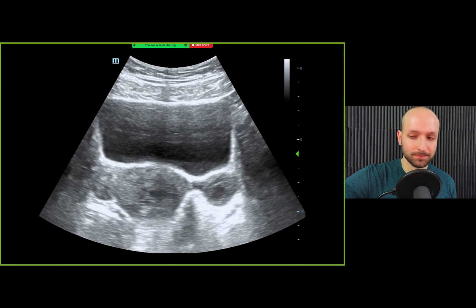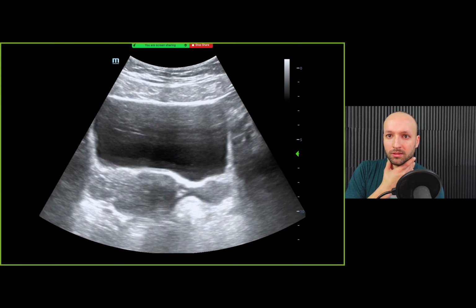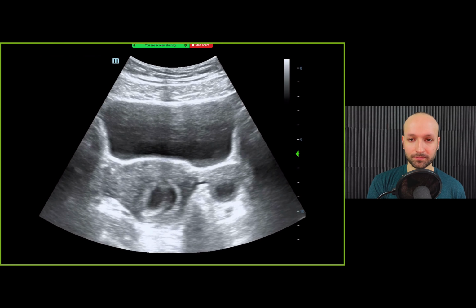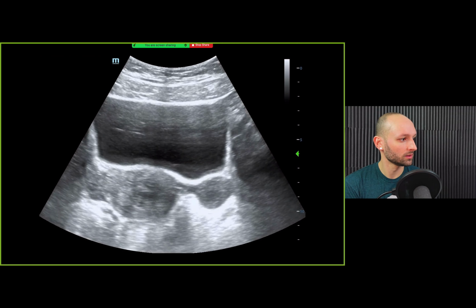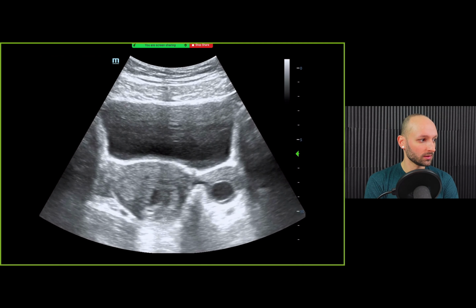Do you remember what the HCG level was for this patient? Not that a single measurement makes a difference necessarily, but yeah. I mean, if it was super, super high, I think I'm worried about some of the heterotopic issues that you mentioned before.